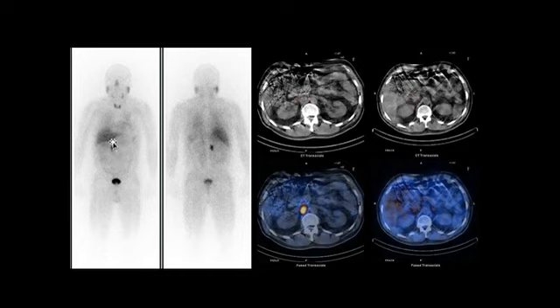There is a focus of abnormal uptake in the abdomen, in the right paramedian abdomen seen right here, and this was localized using SPECT CT to this abnormal soft tissue density at the level of the renal hilum. So SPECT CT helped us localize the activity to an abnormal focus, which was later resected. So SPECT CT in all of these three cases provided valuable information in patient management.